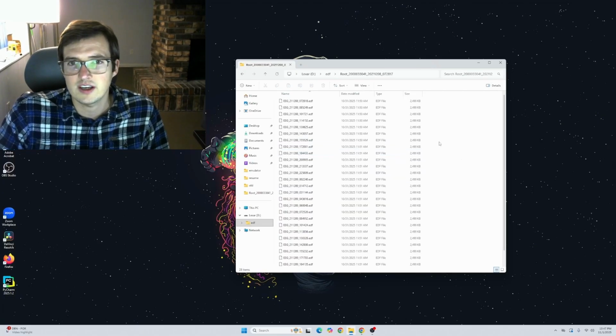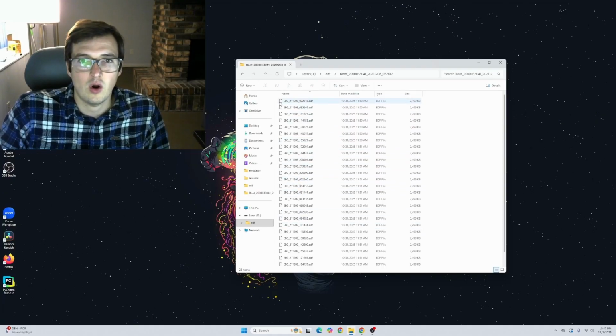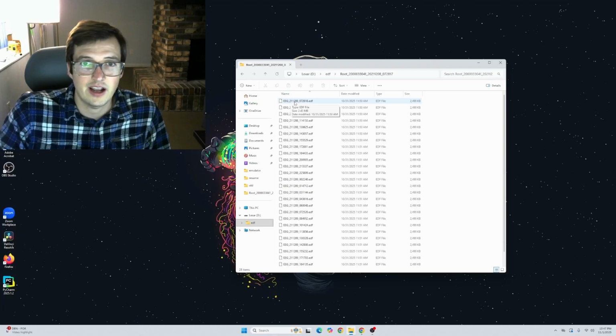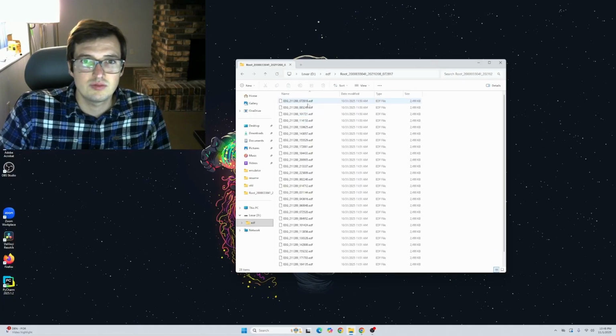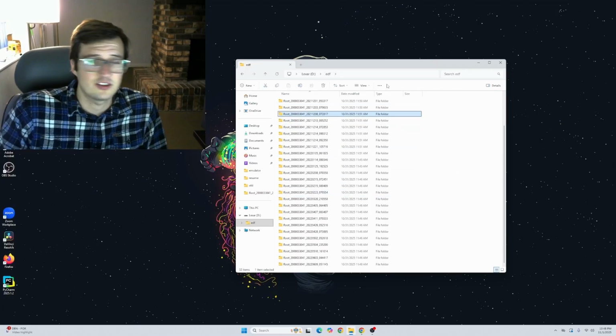So if we just open one of these, you will see some EEG data where they are all labeled EEG. Again, they have some date identifier. So again, this folder thinks it's 2021 starting at December 8th, and it thinks that this first file is dated for 7:28 a.m. All right, that's what all these files mean. So you have all of that. And generally, this is pretty much everything you need to start having your data.